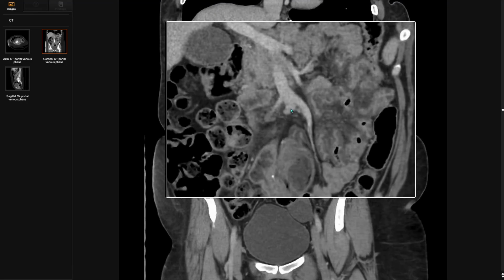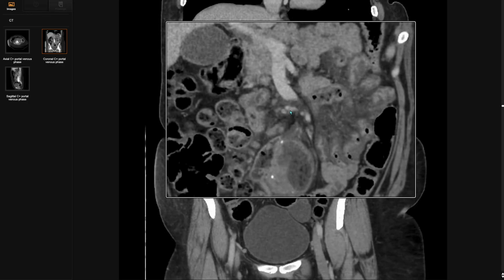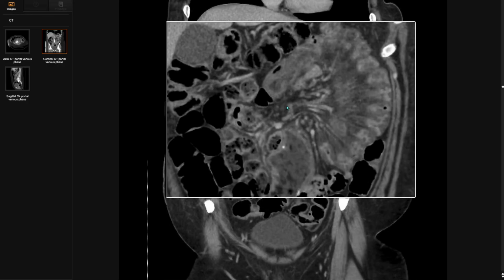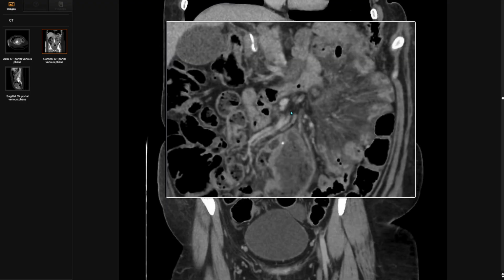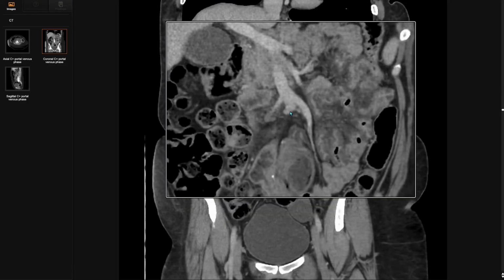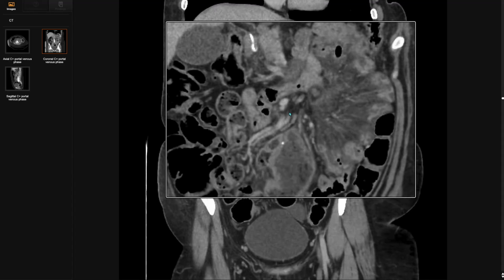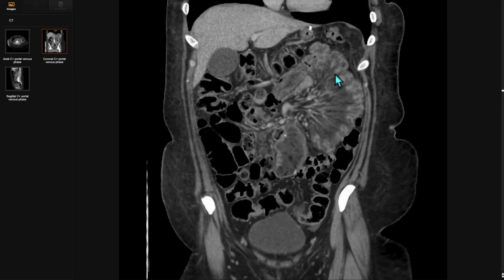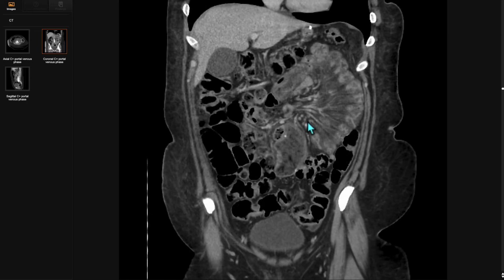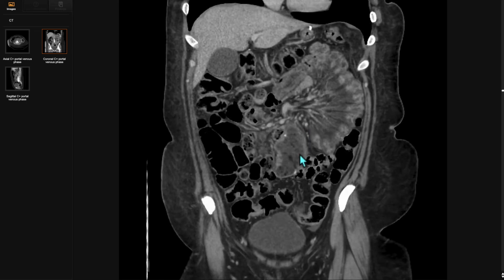And as we carefully look at the mesenteric vasculature, we see superior mesenteric venous branches coming anteriorly and curving up at strange angles, indicating a non-physiologic, non-anatomic configuration of the bowel, often seen in the setting of internal hernia. Internal hernia was confirmed at the time of surgery, related to a mesenteric defect from the jejunostomy.